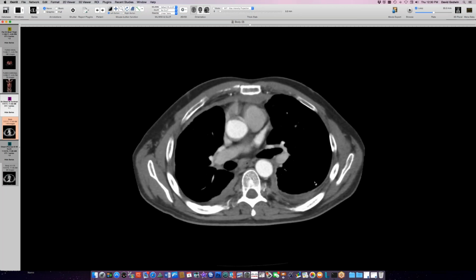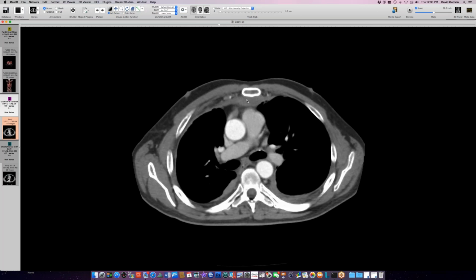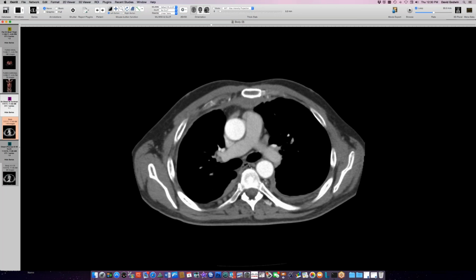And this person had a biopsy. Our considerations when we see something in mediastinal fat and we see something in the pleura, we start to think about infiltrating disease like Erdheim-Chester, because we've seen this distribution of infiltration before with that. This is a chronic smoldering process.